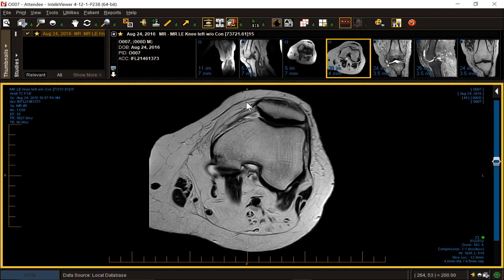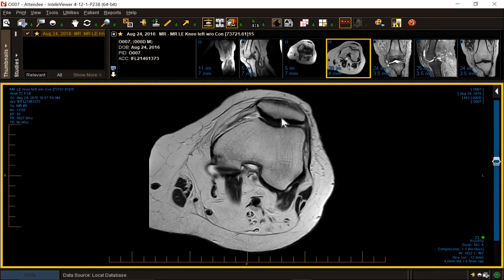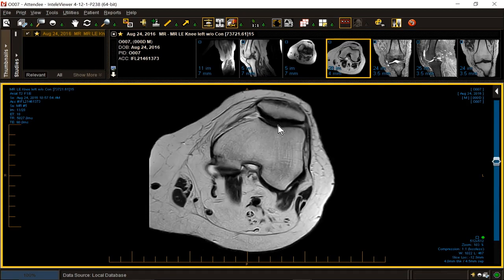So I'm looking at the shape of the patella. I'm looking for deep ulcers. I'm not particularly concerned in a 65-year-old about patellofemoral chondromalacia. As I mentioned, I inspect the lateral retinaculum, the plica, the MPFL, the superficial retinaculum, the medial retinaculum. This is also part of the medial retinaculum, which forms the superficial layer of the MCL. I'll look at how the patella fits into the femur.